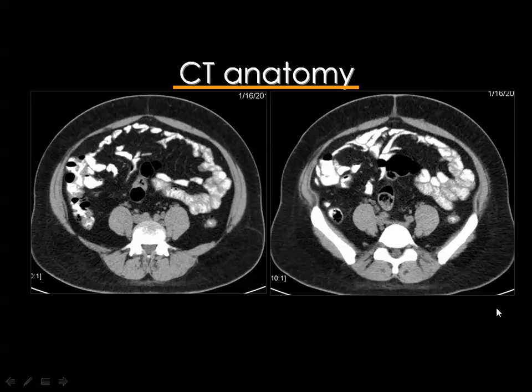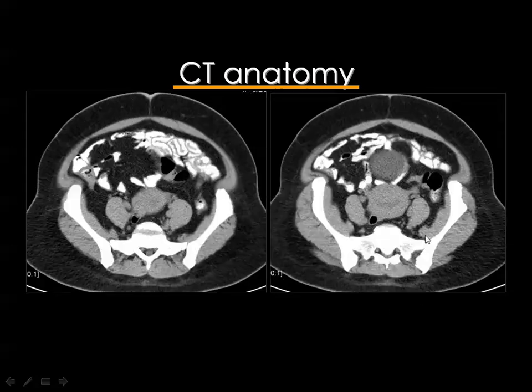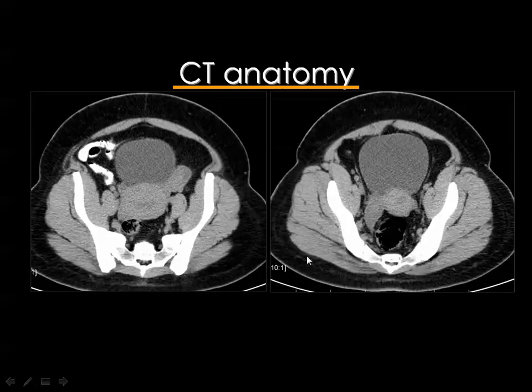of contrast material. At the level of the iliac crest, you see only bowel loops and some of the vessels and the iliopsoas muscle. And going into the pelvis, first you will meet the fundus of the uterus, then you will see some part of the urinary bladder, and lower down you can see the uterine cervix, which is located between the rectum and the urinary bladder, and many times you can see the ovaries by CT, which are better delineated, of course, by MRI. This is the left ovary and this is the right one.